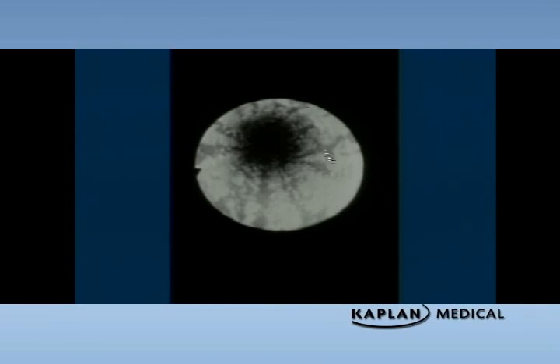However, this is a normal esophagram, nice and smooth and wavy. This is esophagitis up and down the whole thing. This is endoscopy showing you the Candida going down the esophagus. And this is varices. Cancer would not be up and down the entire esophagus.